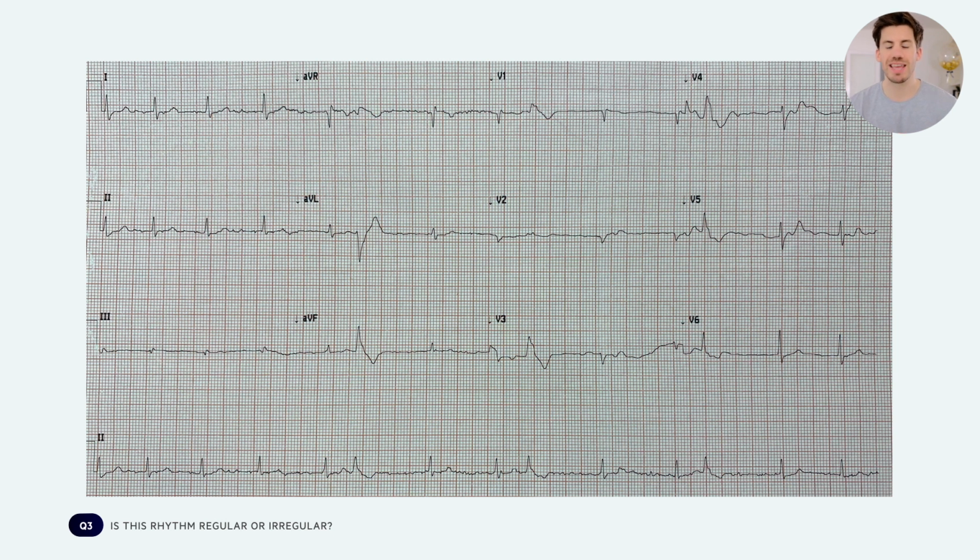Determining whether something is irregularly irregular or regularly irregular is actually very difficult. And here, I would say probably it's more likely to be irregularly irregular, because these random beats, as we'll come to later, are actually ectopics, which complicate the situation. But the principle here is you can recognize the R to R interval is different, so therefore it's an irregular rhythm. And as part of our hierarchy of working out an ECG, we work out rate, then we work out rhythm. With rhythm, we're saying, is there sinus? Is it regular? Is it irregular? Is it fast? Is it slow?